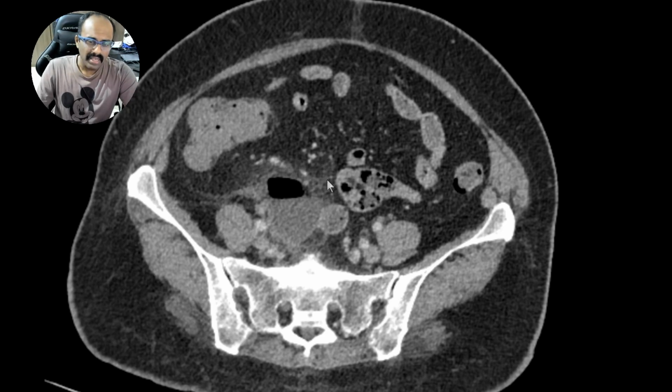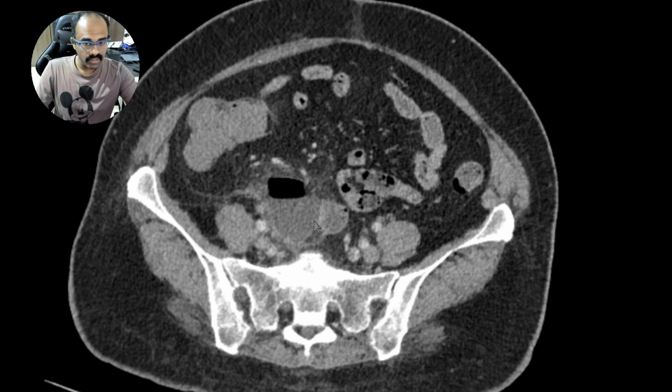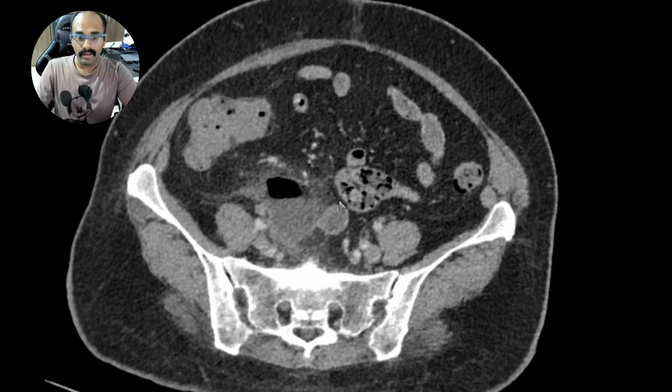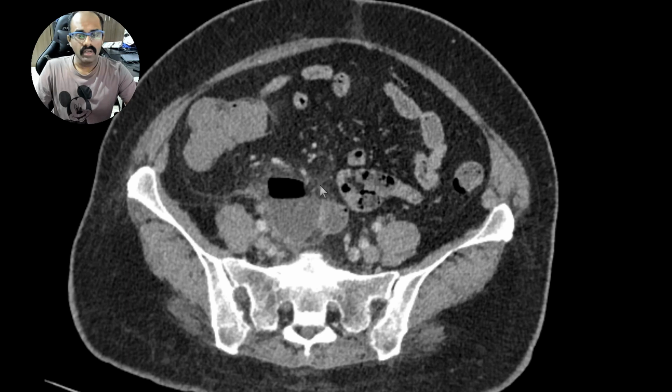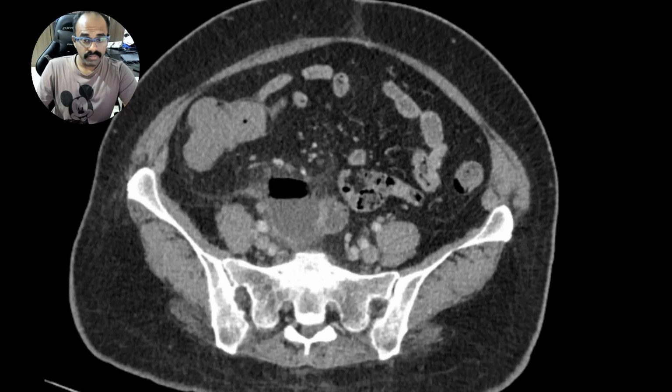But in most of the cases, it is best not to intervene surgically at this point, because if you go in right now and try to do an appendectomy and come out, there is high chance of fistulation, enterocutaneous, enteroenteric fistulations, all that can happen and hamper the quality of life of the patient thereon. So we are better off documenting what is the level of complication due to an inflamed appendix, and letting the physician manage appropriately.